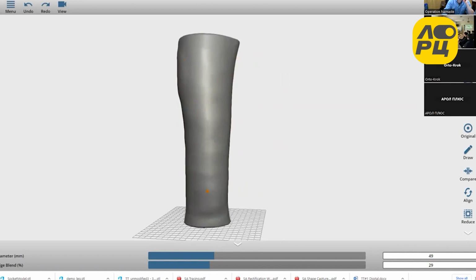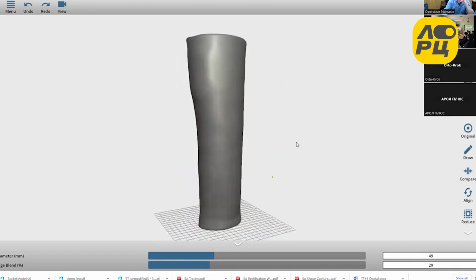Oh, good. No, so I'm just on the screen, shaping the cover.